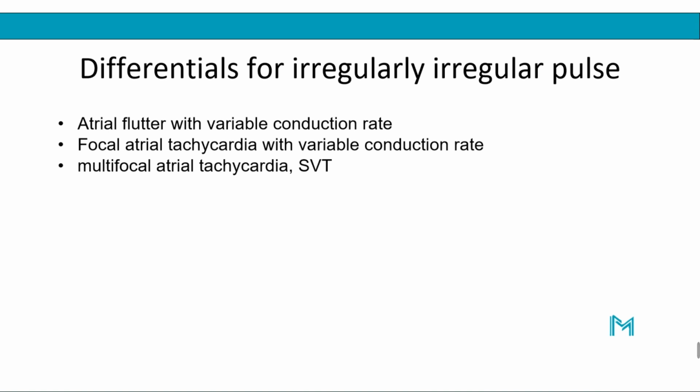So the QRS complexes are spaced out, but the pattern is regular. You know when the next QRS complex will appear, so you have a more determined conduction rate. But when the conduction rate is variable, sometimes it blocks, sometimes it passes through, and you don't know when. So it becomes an irregular pattern, and you now have an irregular pulse.